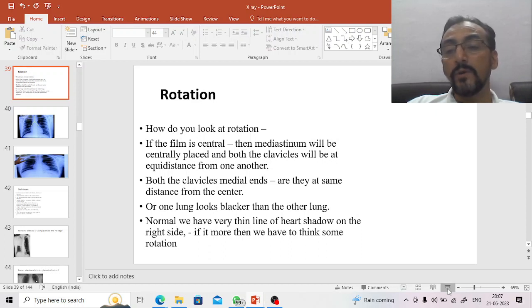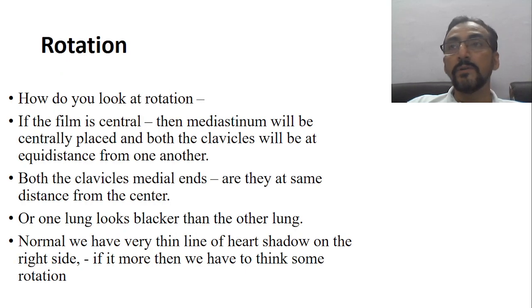As we know, in the last class we were discussing some of the basic things regarding reading of an X-ray. In that we have seen the position as well as rotation. What is the importance of the position? You have to take the X-ray in the right position. If you take the X-ray in a wrong position, that will give the wrong findings.